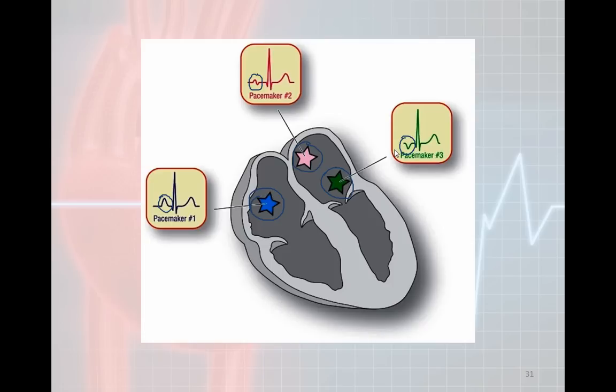Now there always is going to be a slight change in a normal P wave, which is perfectly normal. So if you have your first P wave that does this and your second P wave that does this, technically that could be from the exact same spot. So what we're looking for are three clearly different. As you can see, that one is upright. This one is biphasic with an initial hump.